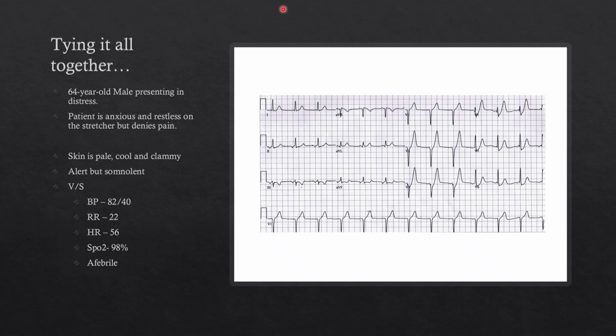If you run through everything we talked about today, it's got a couple of the OMI checklist items, but this is the presentation for the De Winter's T-wave pattern, which is tall symmetric T waves, right? Those rocket ship looking T waves in the anterolateral region with concurrent ST depression. This is an early LAD occlusion.